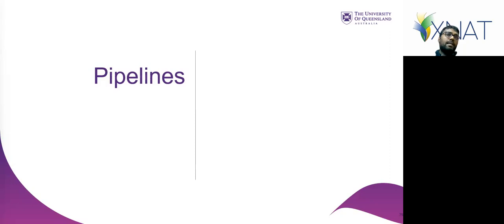I definitely recommend, if you're having large downloads, going via XNAT desktop, or the Utils is probably better for large data, because the API access route is just more stable and better than the browser-based one if you need large amounts of data moved.